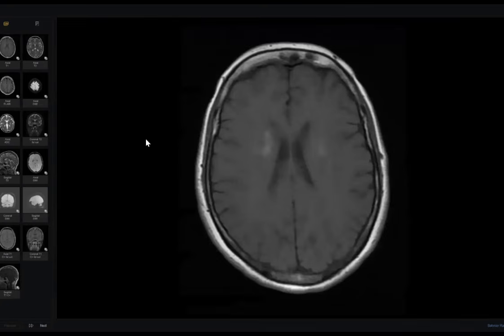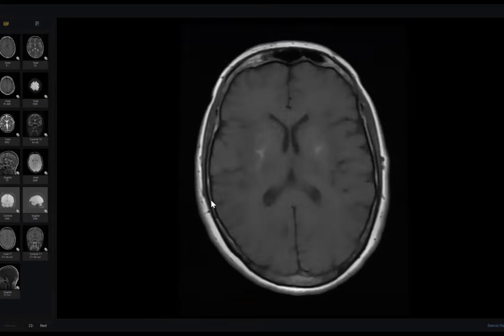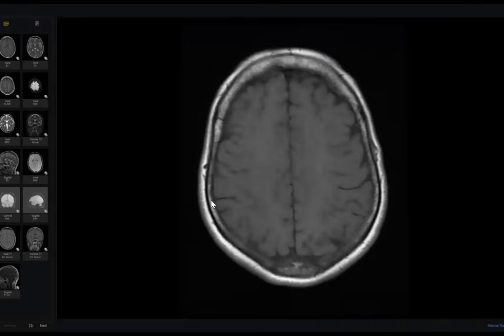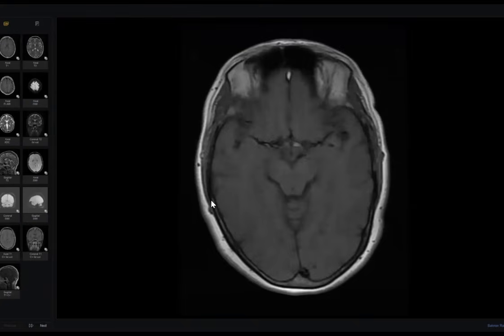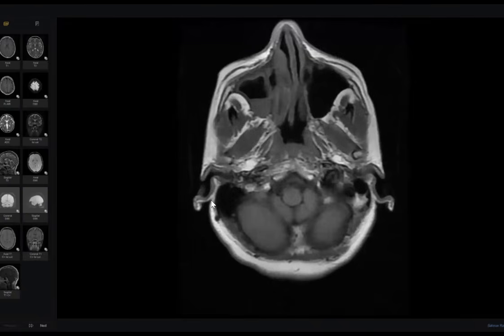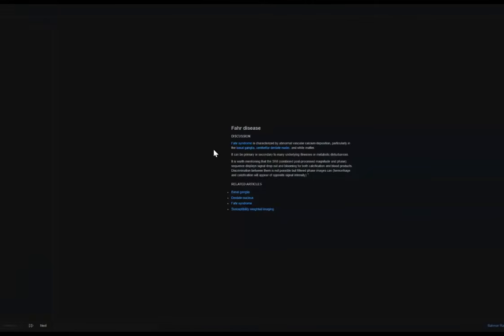In any stage, calcium can be high in T1. Do you know? No. Immature calcium can be high in T1. So if this is calcium, what is the name of this disease? Fahr disease. Fahr disease, correct.